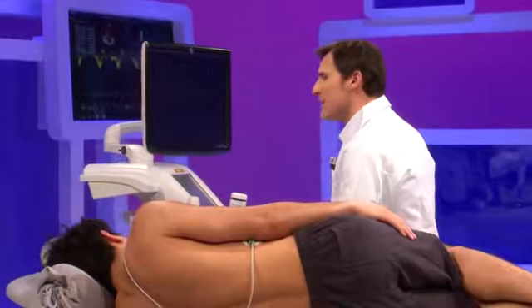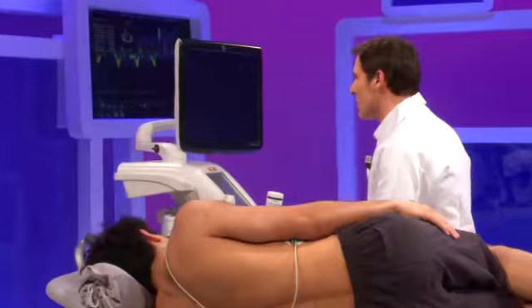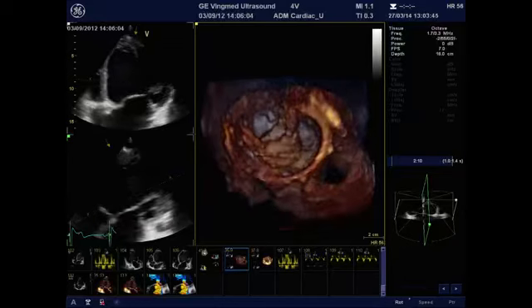So in other words, if I have to conclude, I would say that we have a patient with severe mitral regurg that is secondary due to a significant remodeling of the left ventricle and significant changes in the mitral valve deformation. Just to illustrate all the effect of the remodeling process on mitral regurgitation, it is of interest to use 3D echocardiography. Even if it's not the scope of the presentation, this is just to show you exactly the impact of the remodeling process on the mitral valve leaflet.